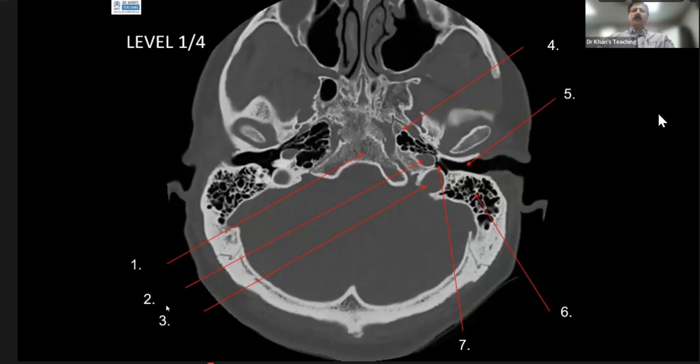Good. Number 2. Okay, I'll give you the answers in the next slide. Number 3, what is this? Number 3.